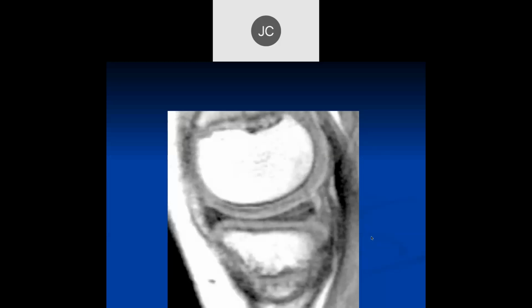Okay, so this is a kid that came in, I think he was 3 years old, who had knee pain. Might have been 4. Looks like medial compartment, right? There is some increased signal within the posterior horn. So you're going to call this a tear and have him go to surgery? How would you describe that? I would say there's increased intrasubstance signal without a high signal tear. Horizontal signal. Okay, I would put in the word horizontal.